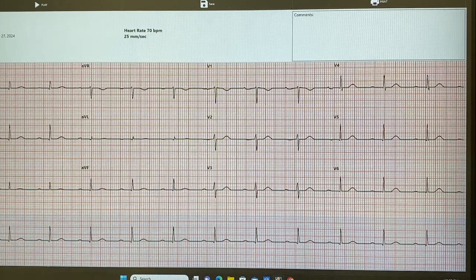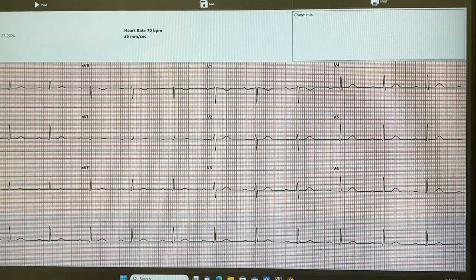What is this rhythm? It's not normal, so what do we call it? First degree AV block. That's right. The rationale is that there's a disruption, some type of traffic, some type of electrical delay. Where? It has to be in the AV node. That's why it's called an AV block.